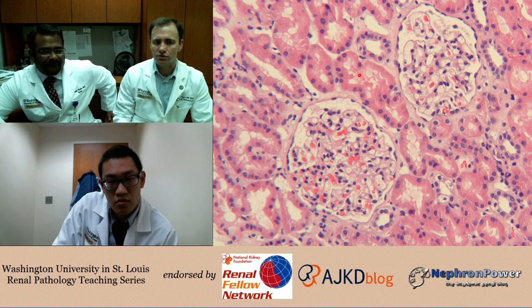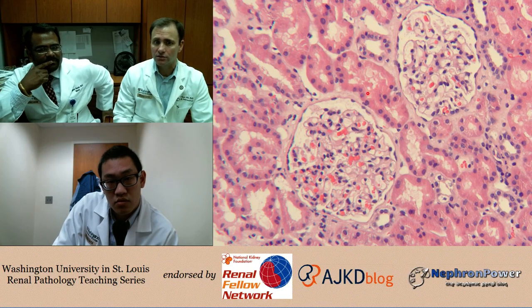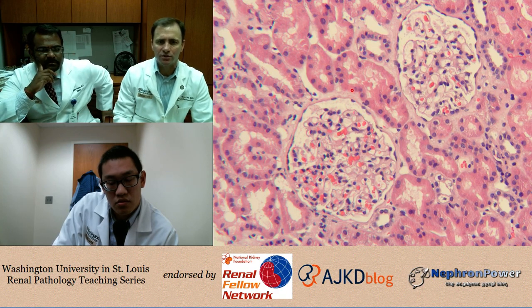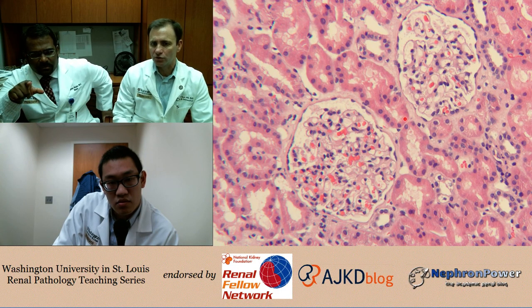When we see acute tubular injury, we would like to see more epithelial simplification of these tubules, where it looks very flat. They would be much more dilated. We might see actually necrosis, dead cells in the tubular lumens here. And we don't really see much of that. You can see some prominent nucleoli. We have one prominent nucleolus maybe right here, although it's difficult to appreciate on this power. You can see multinucleated cells as well. But for the most part, these tubules look unremarkable.